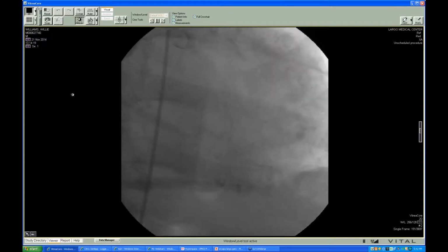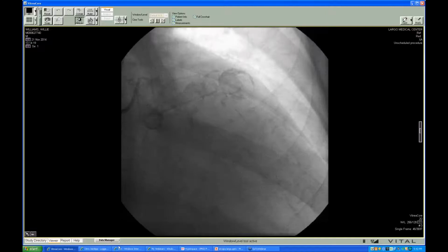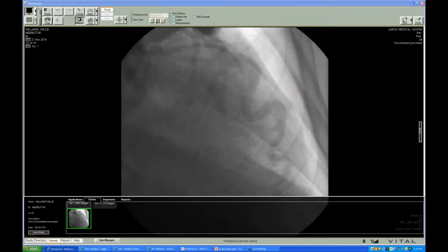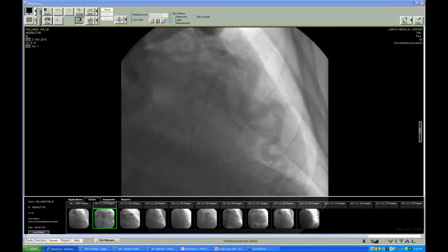Yeah, I think it's set to just run. You want to do it, you can go to Data Manager and go to Series. And then, yeah, now you can pick them.